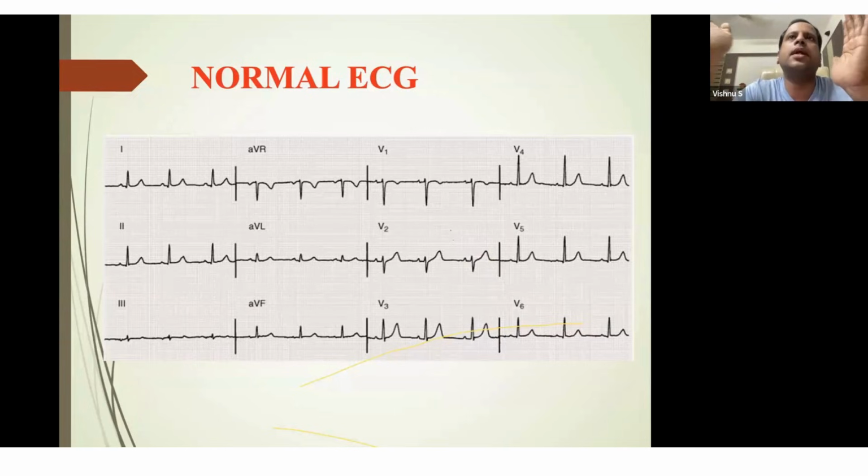ഇപ്പൊ 50 മില്ലിമീറ്റർ പെർ സെക്കൻഡ് എടുത്തു കഴിഞ്ഞാൽ നോർമൽ ഈ കാണുന്ന നാരോ QRS വൈഡ് ആയിരിക്കും, ബട്ട് യൂഷ്വലി ഇറ്റ് വിൽ നോട്ട് ബി വൈഡ്. ഇഫ് യു ടേക്ക് ദ 25 മില്ലിമീറ്റർ പെർ സെക്കൻഡ്, യൂഷ്വലി നമ്മൾ ഈ നാരോ QRS തന്നെയായിരിക്കും കിട്ടുന്നത്. അത് 50 മില്ലിമീറ്റർ സെക്കൻഡ് എടുത്താൽ അത് കുറച്ചും കൂടെ വൈഡ് QRS ആയിട്ട് തോന്നും. അതാണ് പറഞ്ഞ പേപ്പർ സ്പീഡും ആംപ്ലിറ്റ്യൂഡും ഫസ്റ്റ് നോക്കിയിട്ട് ECG ഇന്റർപ്രിട്ടേഷൻ തുടങ്ങാൻ പാടുള്ളൂ.